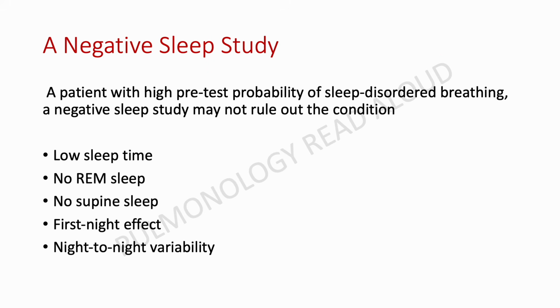With that, there may be circumstances where you will have a negative sleep study, but you were expecting a positive sleep study. If you think that your patient is a very high suspect of a particular sleep disorder, and you did not have the right result, you may actually have to repeat the study.